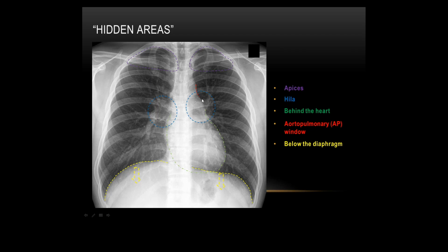So you've got your pulmonary artery coming up over it, and then you've got your bronchus coming down. Can you see how this is sort of concave here, isn't it? Now, if you start to get lymphadenopathy growing around all this region here, what's going to happen is it's going to bulge that AP window out.